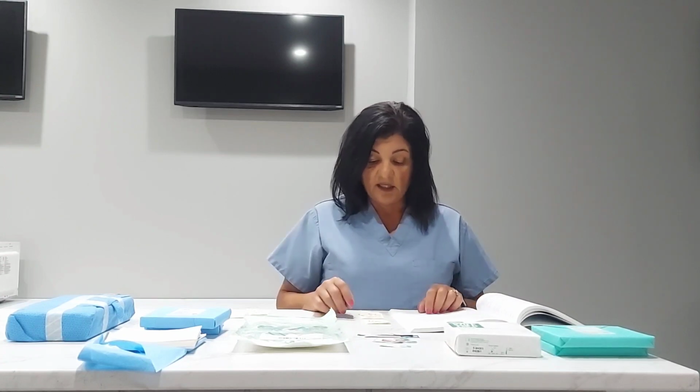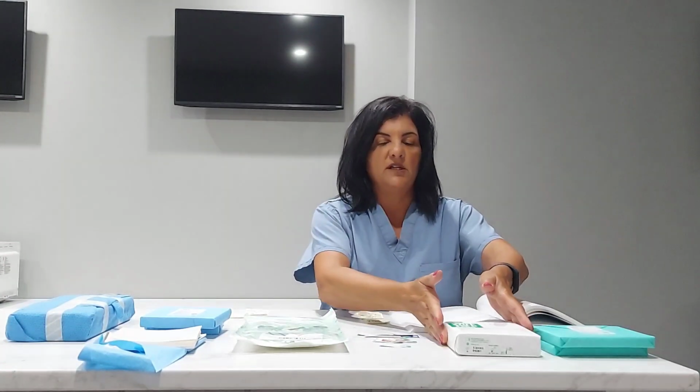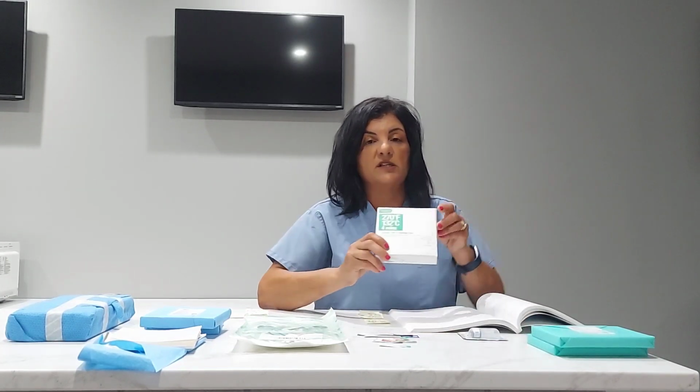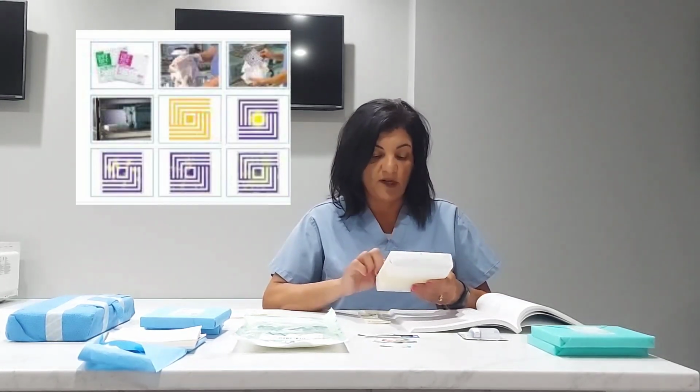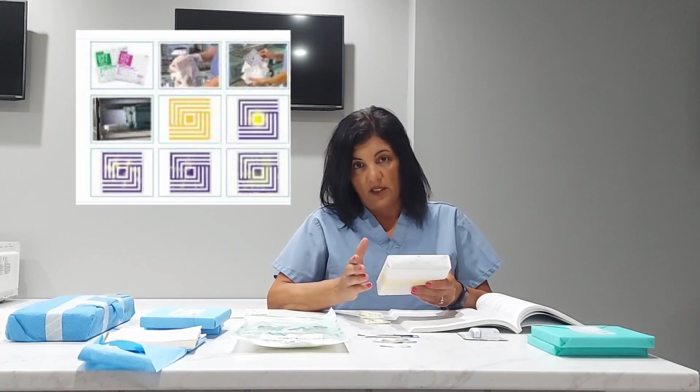Now a type 6 indicator is designed to react to critical process variables. So for example, some of you may or may not have ever seen this. This is called a success pack. This is a type 6 chemical indicator, and it's for a specific sterilization process, and that process is for steam flush pressure pulse sterilizers running a 270 cycle for 4 minutes, which is a pretty standard cycle.